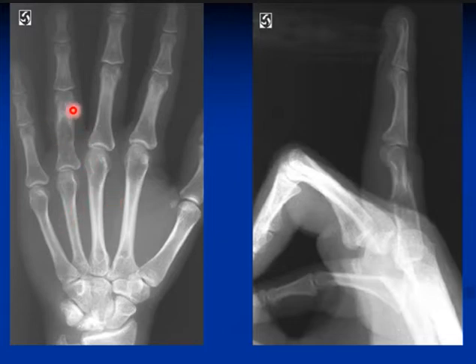Yes, there is a lesion. This is lytic, not sclerotic. Where is it located? Cortical or intramedullary? It is intramedullary, lytic, and well defined with a sclerotic margin. Surrounded by some periosteal reaction? I don't think there is any periosteal reaction, but let's see.